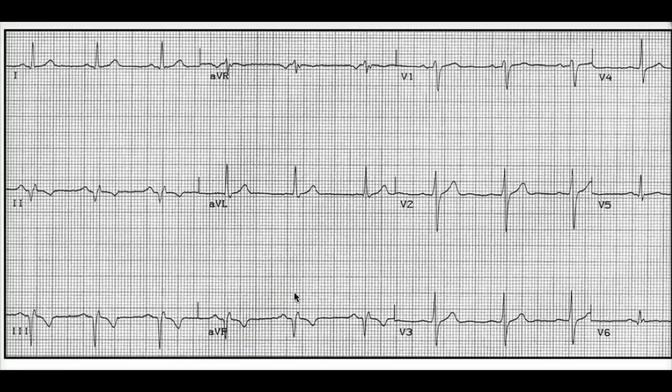In this particular video, I'm only talking about how we can recognize a Q wave. In the subsequent videos, I'll be talking about, okay, when we see a certain Q wave in a certain lead, we have to determine where exactly the infarct is in the heart. But let's take one step at a time. In this video, we can see that the Q waves are building up in 2, more in 3, and we can also see that in aVF.